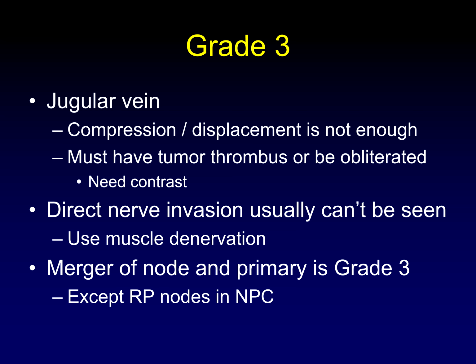except as we talked about earlier, retropharyngeal nodes and nasopharyngeal carcinoma so frequently have that appearance of a single unit that we're not going to count that. So except for those retropharyngeal nodes and nasopharyngeal carcinoma, the merger of node and primary is considered grade 3.